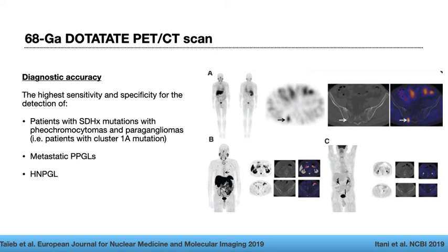metastatic disease. They belong to a 60-year-old woman with a familial pheochromocytoma paraganglioma syndrome, status post-right adrenalectomy, who presented with a recurrent increase in plasma metanephrine level 5 years ago. Panel A represents the MIBG scan done during that time, 5 years ago.